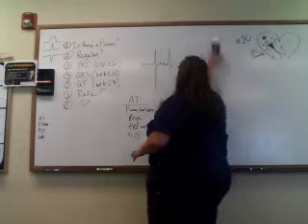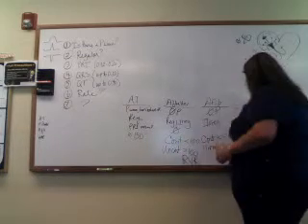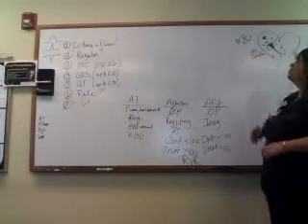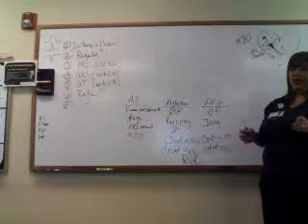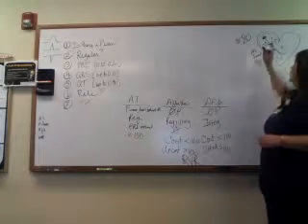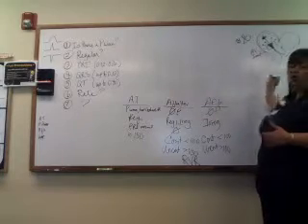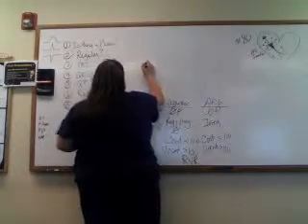And so I hope you answered yourself and said no. That would be okay, 80 would be fine. So what happens with this one is we have multiple stimulation points in the atrium that are firing. So they're going to have different shapes and they're going to have different PRIs. But 80 is okay, so the little guy is going to let all of the stimulation points down. So let's see what this one will look like.